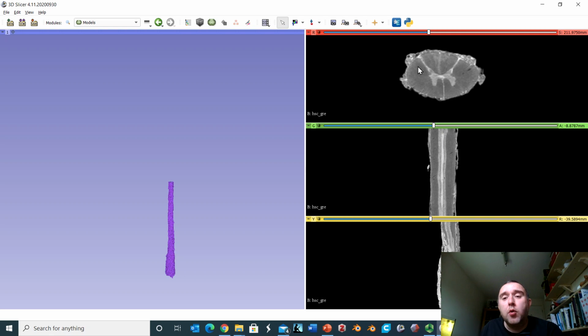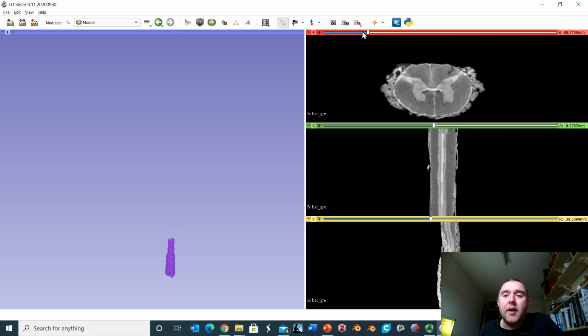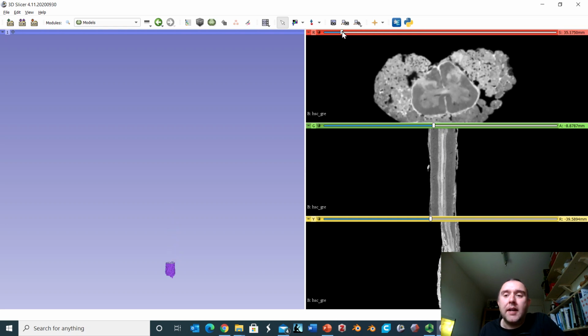Within the thoracic cord and the upper lumbar cord, for that matter, remember, not only do we have a dorsal horn and a ventral horn, but we also see this lateral horn, which contains sympathetic preganglionic neurons. Then as we continue to descend, we start to see the cord getting bigger again, and as we get to the lumbar enlargement, we'll see the grey matter regions expanding, as we can see happening now.